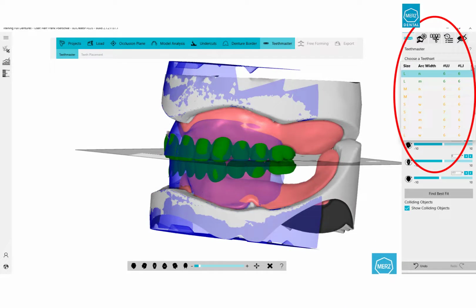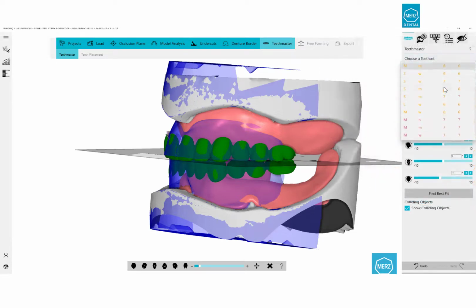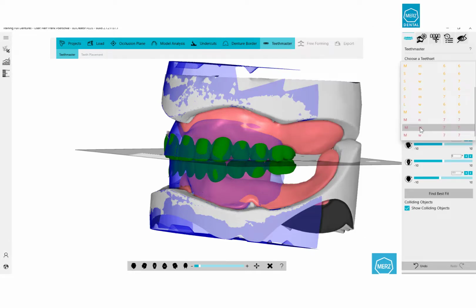From the selection menu on the right-hand side, all other rows of teeth can be chosen. According to a mathematical consideration of the software, green setups can be used well. The yellow ones can be used with corrections in the position. The software does not recommend using red rows, but in principle the user can choose any row of teeth. The pre-selection by color is only an assistance to find a good match quickly and easily.